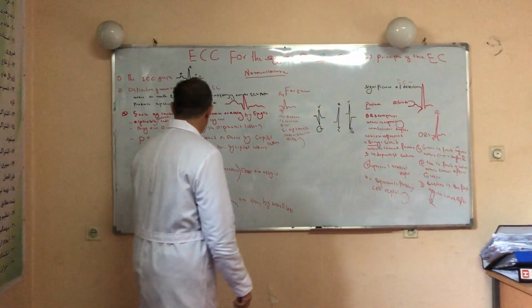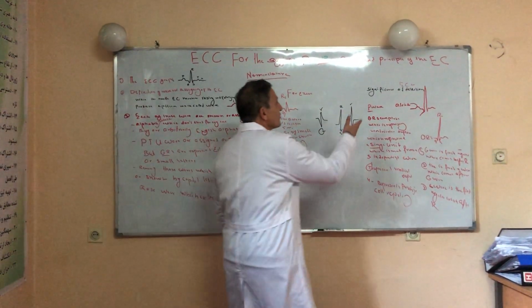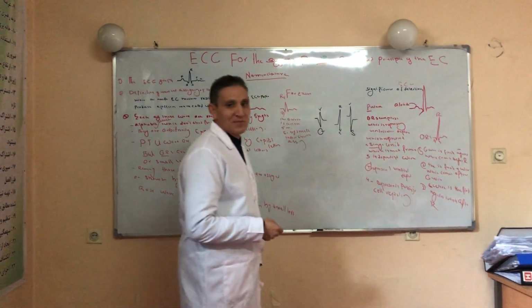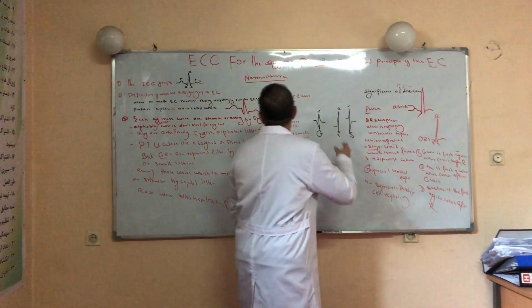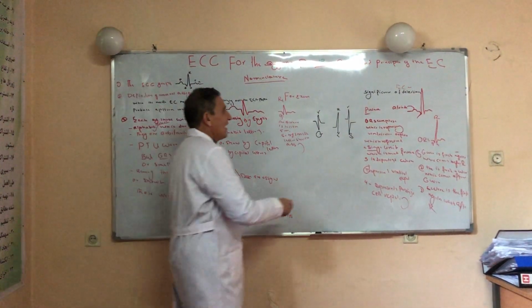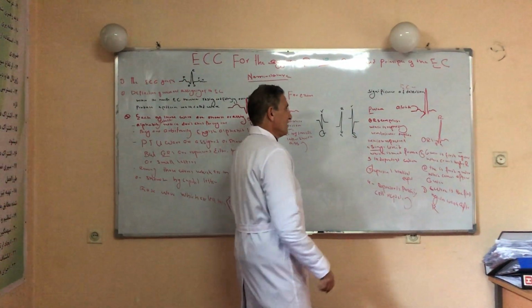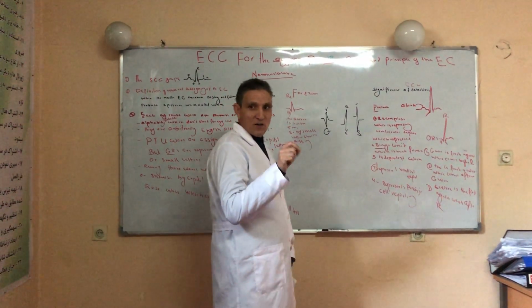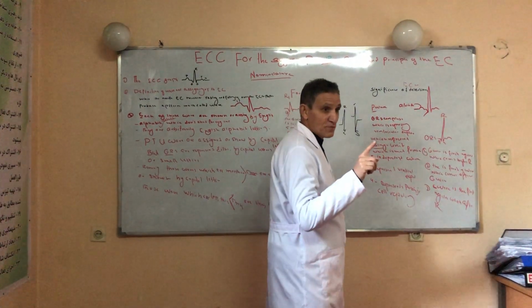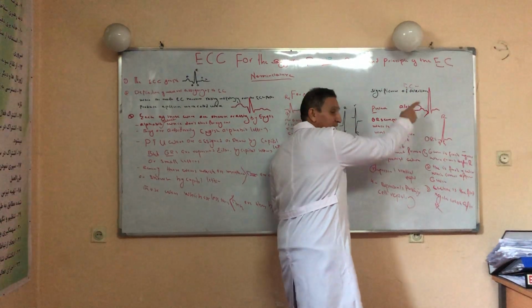Another topic is the significance of ECG deflection. What does it mean, significance of ECG deflection? Right now we come again to this ECG graph. What is the P wave representing? What kind of wave is it? This is a small, round-shaped wave, and this is the first positive wave, which comes earlier than the others.